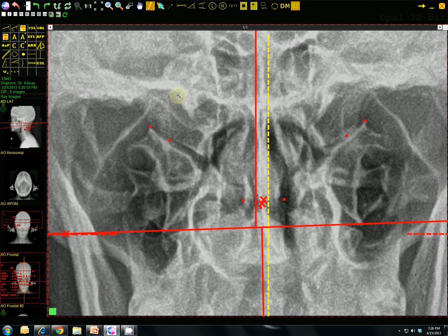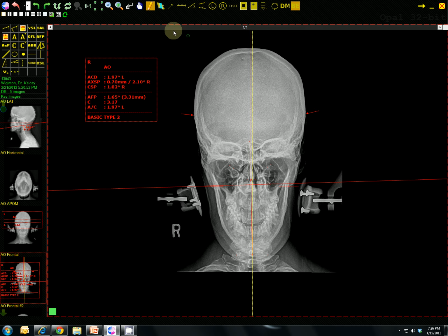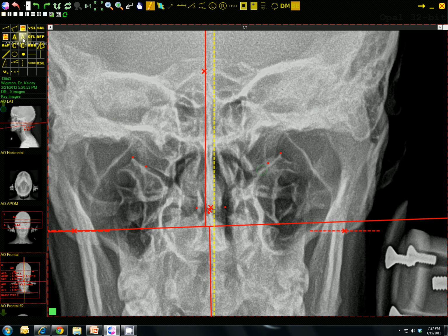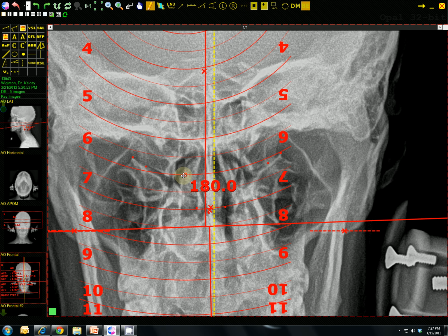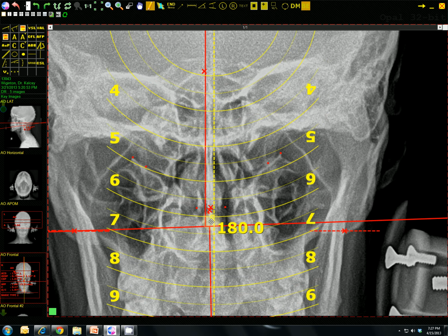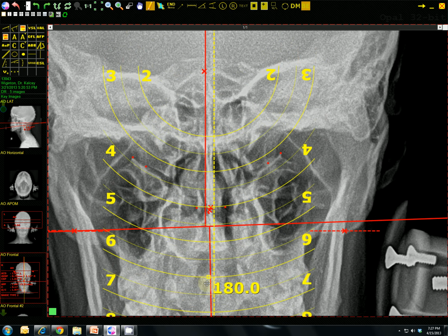Okay. Now at that point, that's going to give us a calculated condylar circle. You can see that it is at 3.17. So I'm going to come back up. Now place the condyle circles template to place this down. A little bit of a lag because of the video.